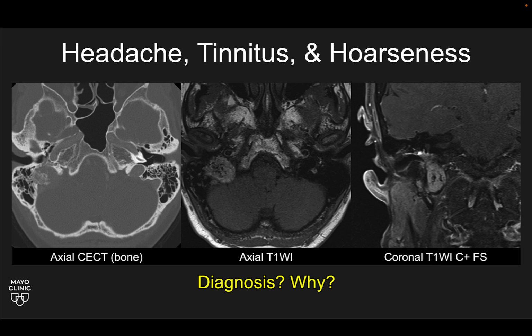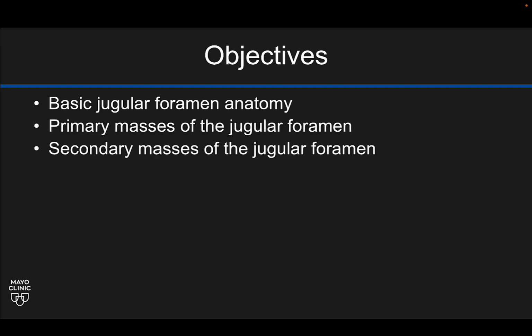So again, history is headache, tinnitus, and hoarseness. What's the diagnosis here? And importantly, why do you think that's the diagnosis? I'll give you just a couple more moments to look at this. Okay, we'll circle back to this case at the end of this talk.